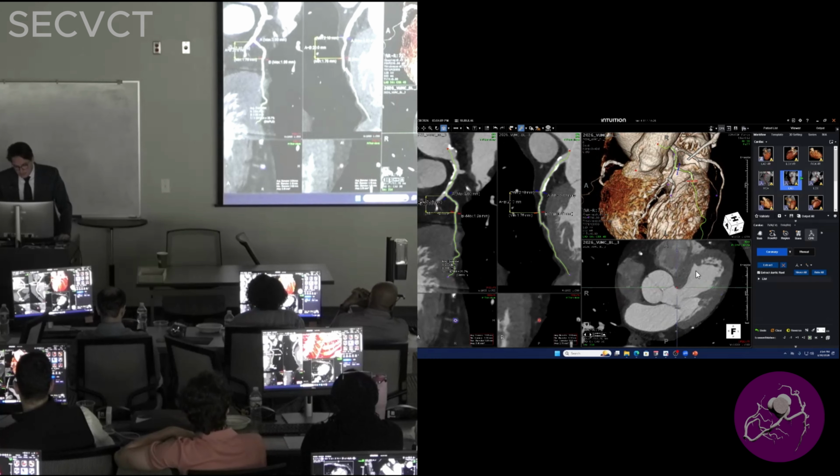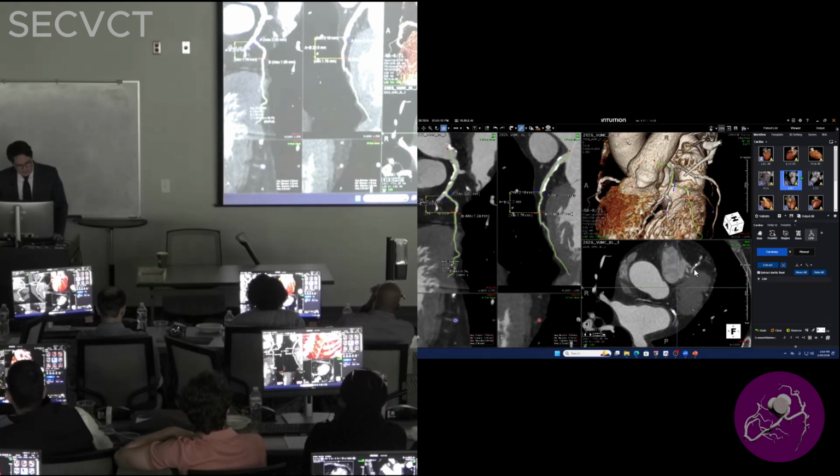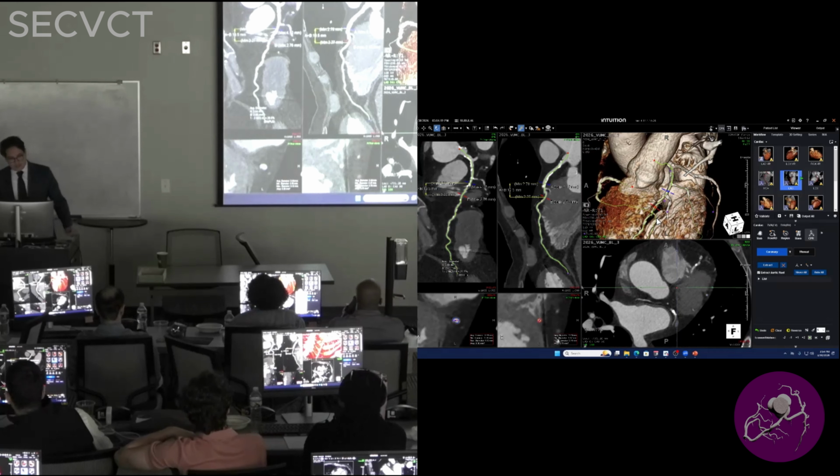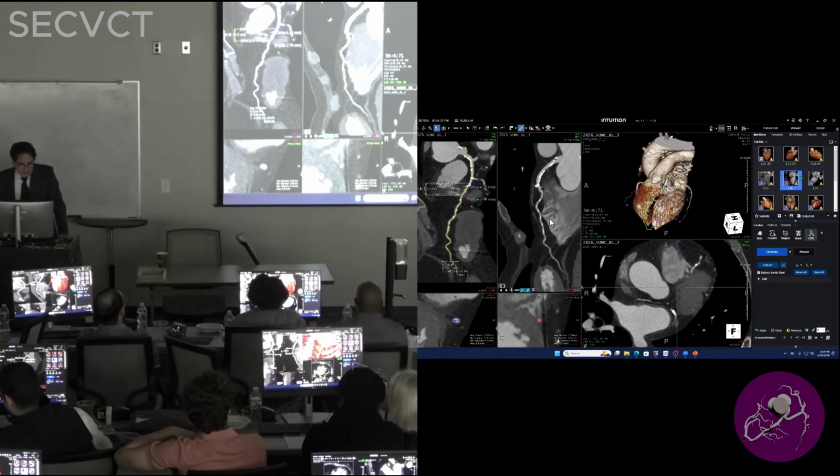and we're gonna zoom in and we're gonna find the LAD. So we have the LAD here, we're gonna shift and then we're gonna click, and now it's segmenting it correctly, right? So now we can see that the LAD is segmented. And we can check the LAD here.